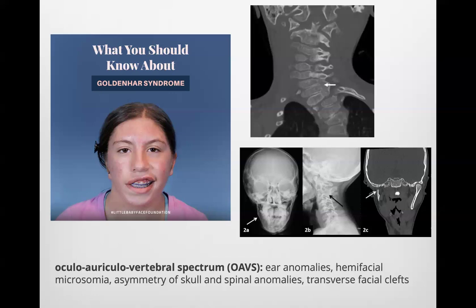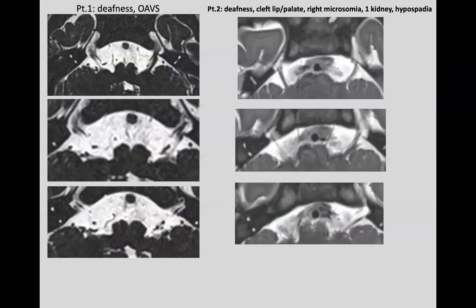Interestingly, we started to see these patients because we are studying inner ear malformation, and we saw a lot of cranial nerve abnormalities in these patients. Look at the fifth nerve here in these two cases. This is a trigeminal nerve going into this enlarged Meckel cave, and from the Meckel cave, the seventh nerve goes laterally, and there is no eighth nerve.